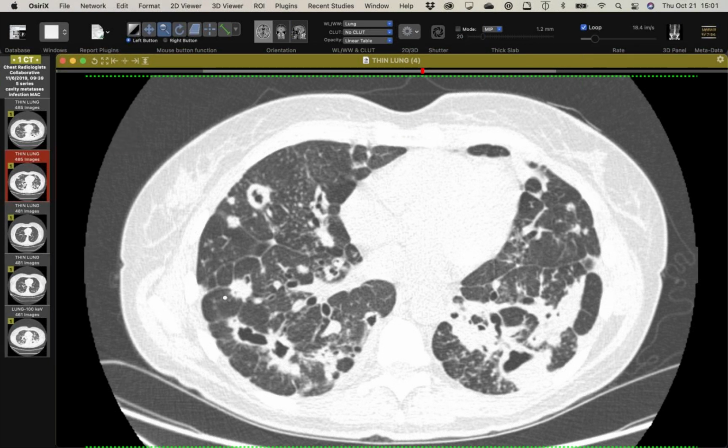But I was kind of curious. This is, I think, the first time I've seen superinfected metastases, but they've been around for about 3 years, so she's had time to let something brew in there, and they've been held in. That was really interesting with how the cavities got there. And it's the only site of disease. Wow. So the bevacizumab seems to be holding it in check mostly.